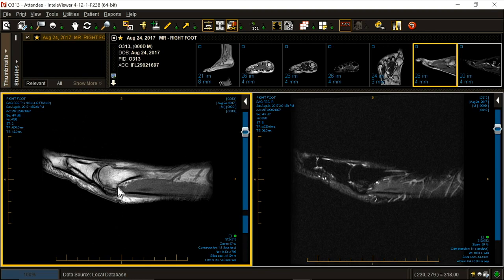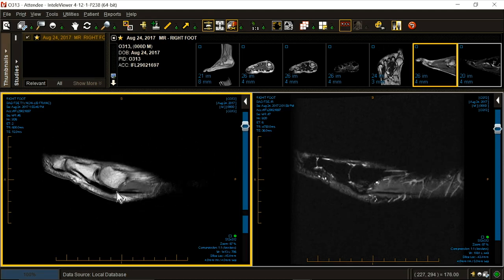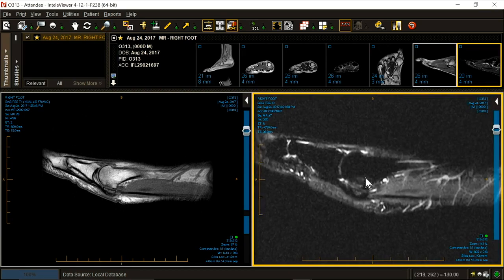So let's start out with the first MTP. Hypertrophic deformed fibular sesamoid. Arthritic, flattened, thinned, edematous, tibial sesamoid with sesamometatarsal chondromalacia. Remember, there is hyaline cartilage here. So that's arthritic. It's going to hurt.